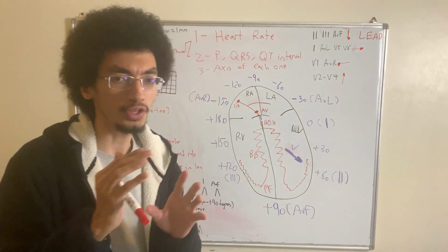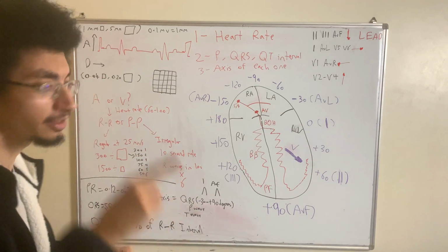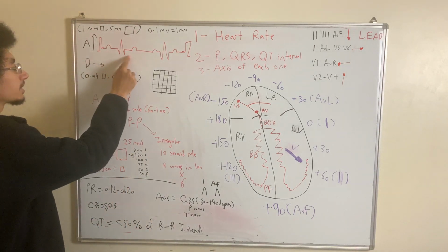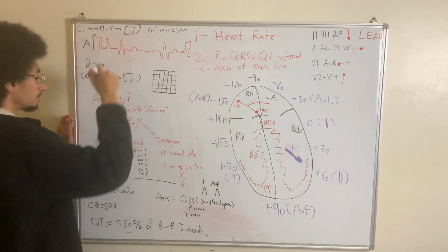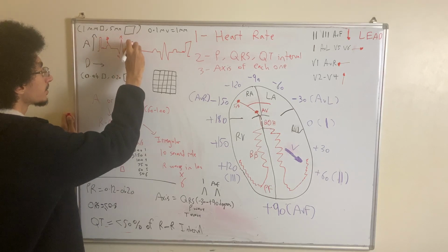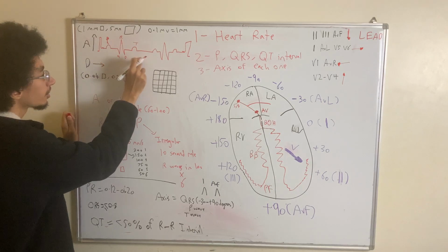And one more thing I just want to mention before we go to the heart rate, there's just one more thing that we need to keep in mind when we're reading a normal sinus beat. Okay? You see the QRS complex, this is the QRS complex, right? Let me put it here. P wave, we have a P wave, we have a PR interval, Q, R, S, T wave, and there's an ST segment, and there's also a QT interval here.